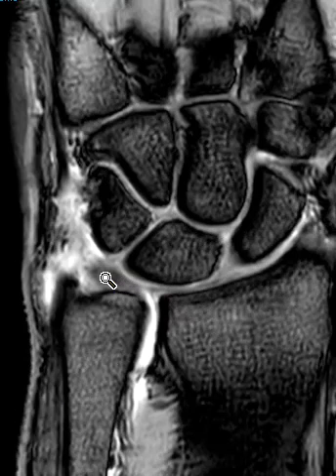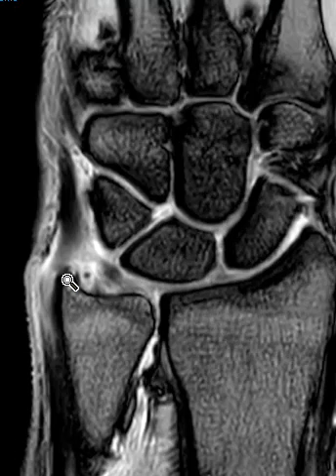And then over here we have a couple attachments. One comes down to this little cupped area. That's the foveal attachment. It looks like that is torn, and the TFCC comes over here and drifts upward rather than downward into this. And this is the styloid process. It looks like the TFCC is torn from the styloid process.